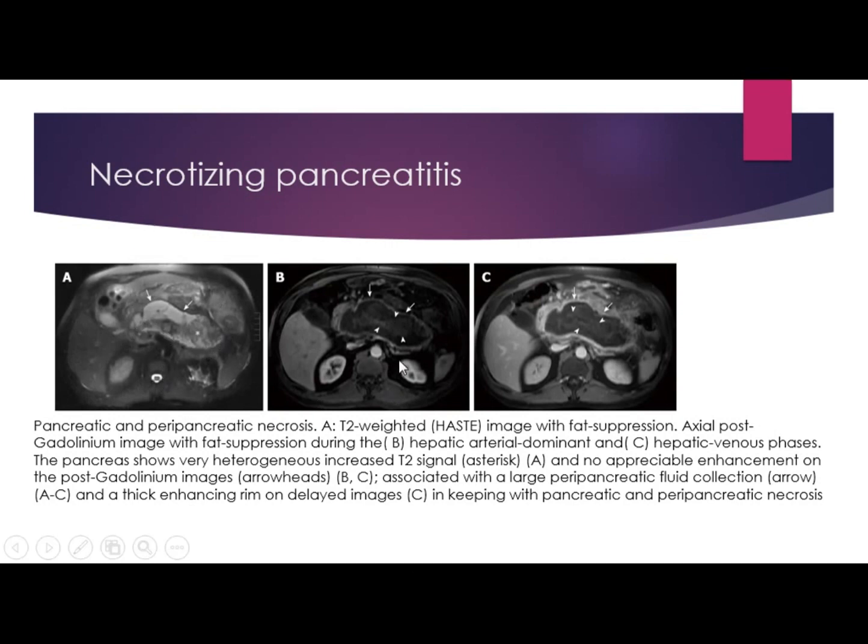Here, the hepatic arterial dominant and the hepatic venous dominant phases. So these are T1 fat saturated post-contrast, showing here no enhancement, and after the hepatic arterial phase, strong enhancement here.